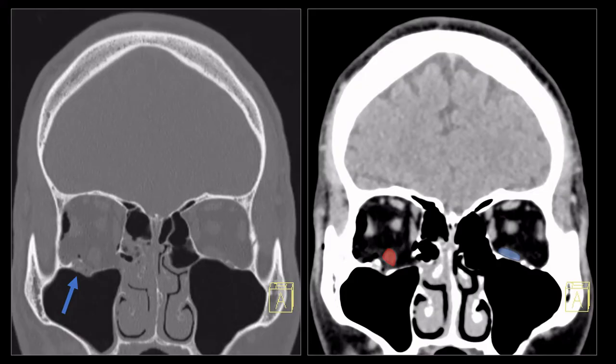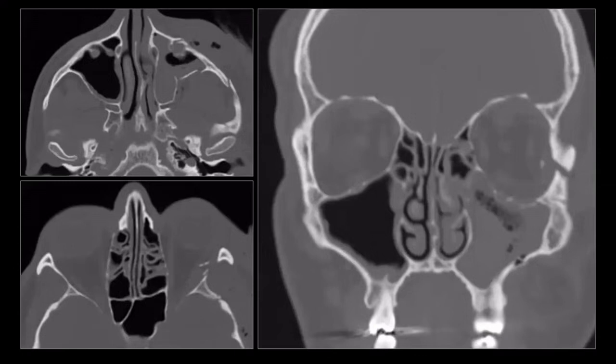And this change and contour deformity is also suggestive for some displacement. Because the fracture fragment is somewhat depressed, the muscle gets slightly pulled along with it, causing a contour deformity. So this is not a full-blown herniation, but nevertheless it is suggestive for limited herniation of the rectus muscle and should be communicated with your referring physician.